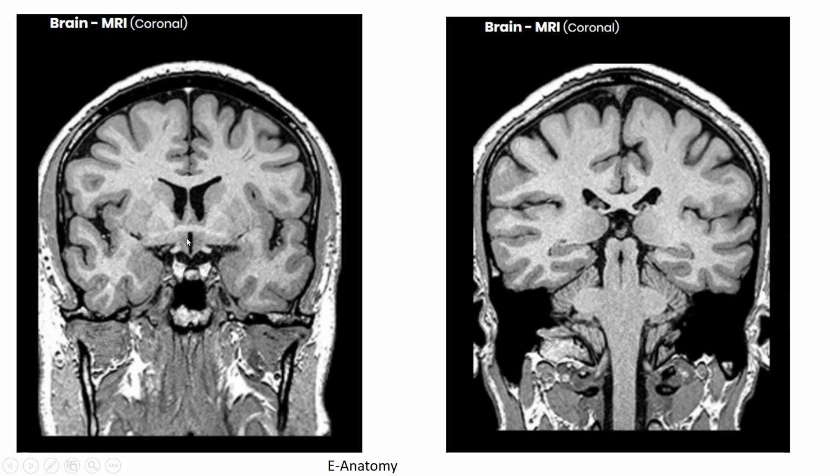And we are almost getting into the third ventricle here, and the pituitary gland. We're just a little bit anterior of the body of the pituitary gland and the third ventricle. So anterior to that is the anterior commissure, and you can see that right to left tract right here. That's really nice to see.